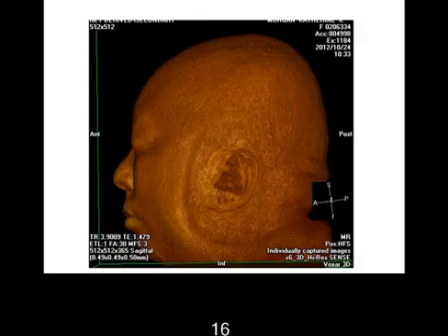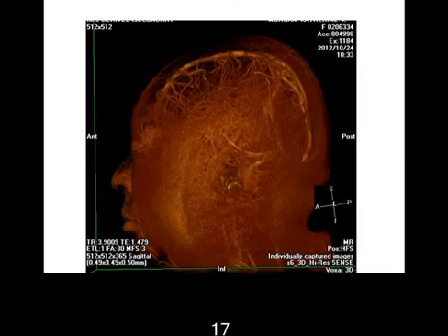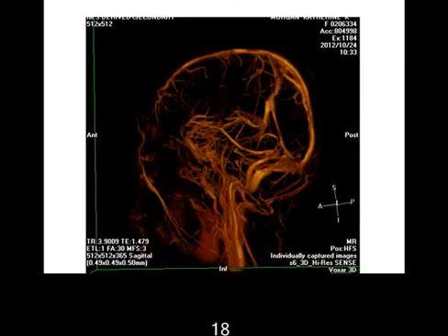This is a patient that we did a 3D volume rendering. Basically, we did an MRI, an MR venogram, and then from the information we can use a computer to reconstruct the surface. I can window out, take out the soft tissue, and can see some of the veins. You can half see the brain, and then take the face out. Now the veins show up. Some arteries still show up, but we're studying the dural venous sinus.